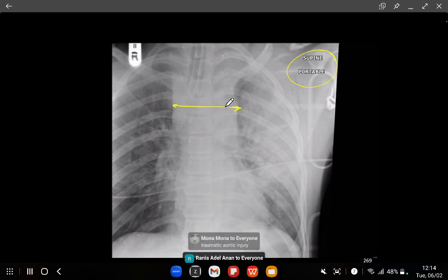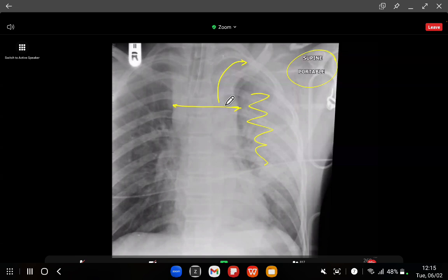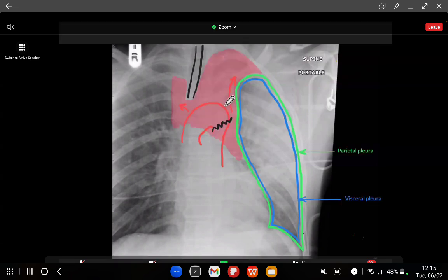And so when it can't get any wider, the blood just pours out over into the superior sulcus in an extrapleural fashion. We've got a fractured clavicle up here. We've got contusion in the lung here. And this really is the apical cap, which tells us that there must be a significant intramediastinal injury.